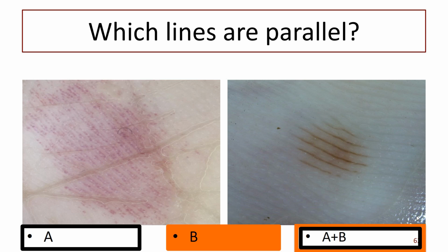No glands. You've almost got it right, but they're not glands. Little white things, these dots. Yeah, they're actually not glands. They're deep down in the skin. They're actually the pores from the ducts. Okay, so there's the sweat ducts. Okay, and are they on the ridges or on the furrows?